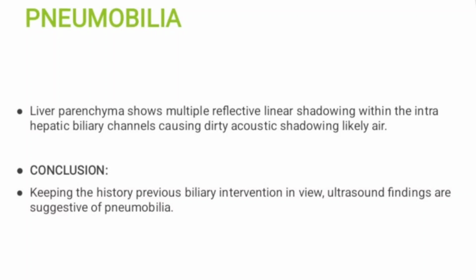Conclusion would be, keeping the history of previous biliary intervention in view, ultrasound findings are suggestive of pneumobilia. As I mentioned, there must be a previous intervention, so always take the previous history of the patient, and then whatever you have seen on the images, mention the characteristics of the images on the report, and then give your conclusion. And if you have any suspicion, you can write on your report that clinical lab correlation would be suggested, and further radiological imaging would be very helpful for further diagnosis.